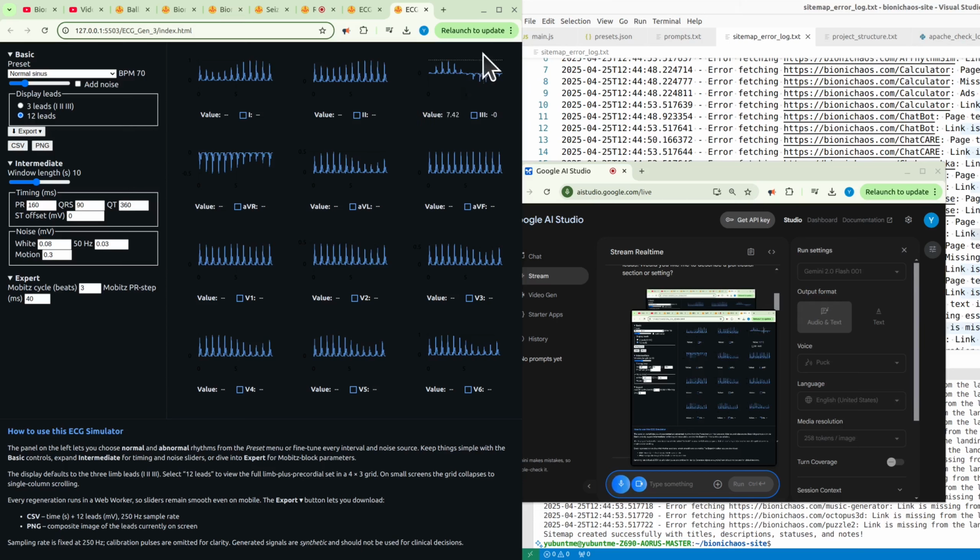Okay, why is it different from the other waveform? Compared to the other waveforms, lead 3 looks like it has a different morphology. And it's not updating in real time like the others, staying relatively flat. Again, why is that? Why is it different? Is it normal or is it specific for this data set?